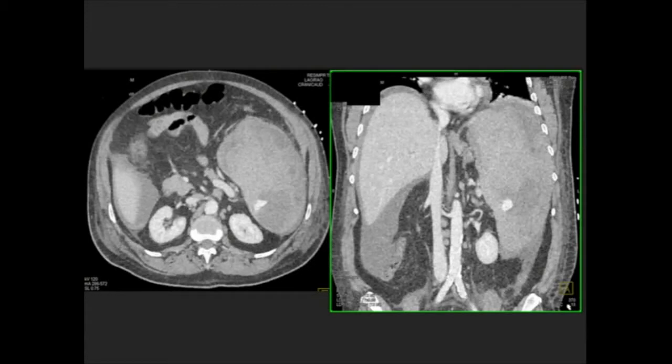But I've seen mononucleosis, big spleen, and spontaneous bleed, and the spleen is often irregular in contour. That's a possibility. Sarcoid involves the spleen. I haven't really seen a case of sarcoid with spontaneous splenic or hepatic rupture, but I guess it could happen, or spontaneous bleed, it could happen. This is not a normal spleen with spontaneous bleed due to mild trauma.